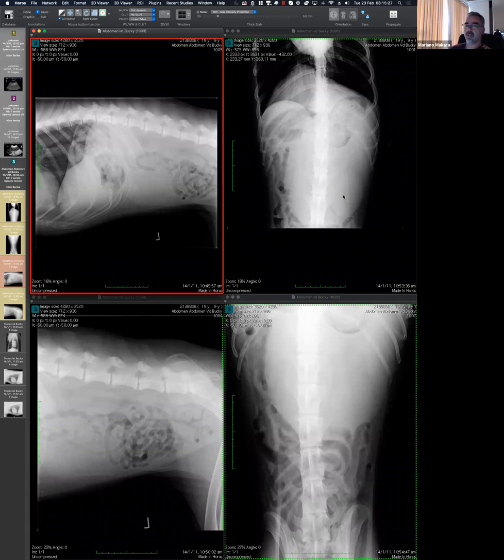So in this case, coming back to that discussion, I think there is something there that is not allowing the small bowel to sit where it should be. So there is a mass, if you want to call it mass effect, I'm okay with that. I would have no issue calling that a mass. It's acting like a mass, it is displacing the bowel.